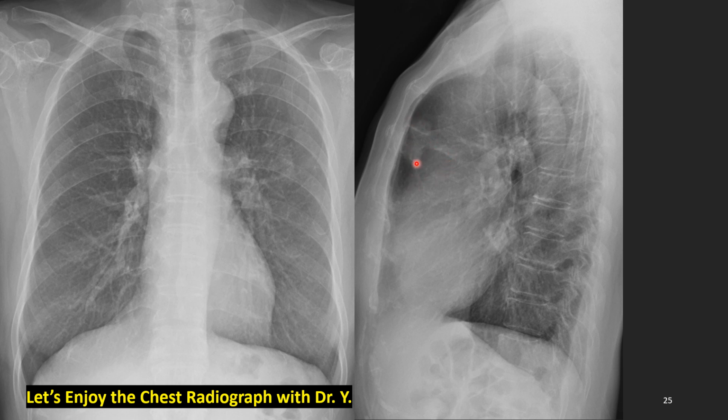This is lung cancer. Let's go back. Maybe here. Increased opacity, a slightly irregular, ill-defined border of normal anatomy. But still I'm not sure about the findings here.